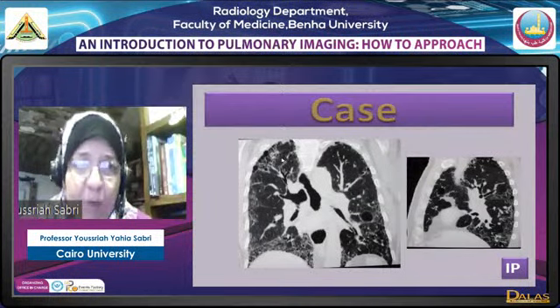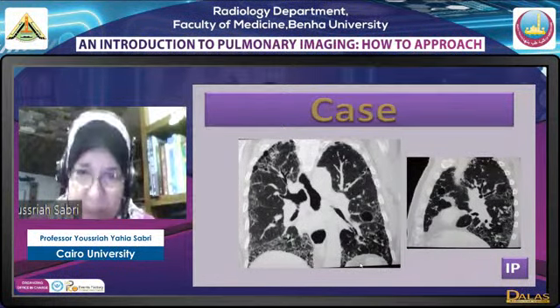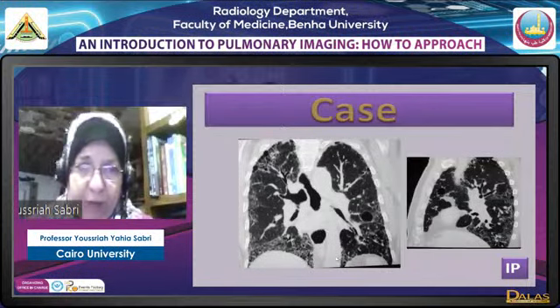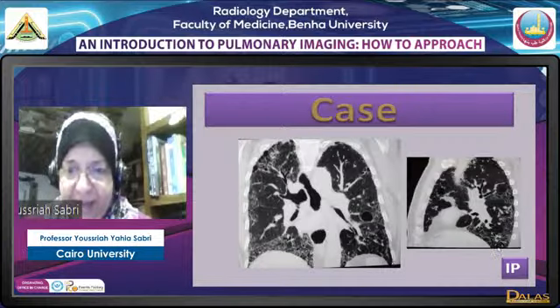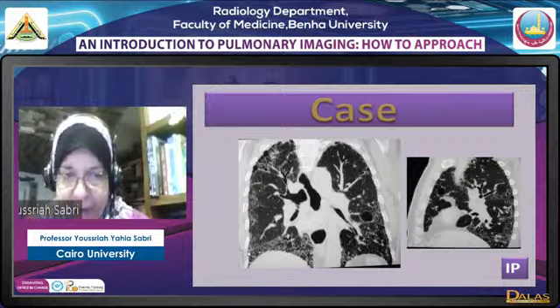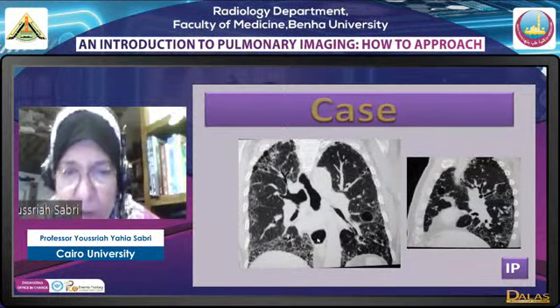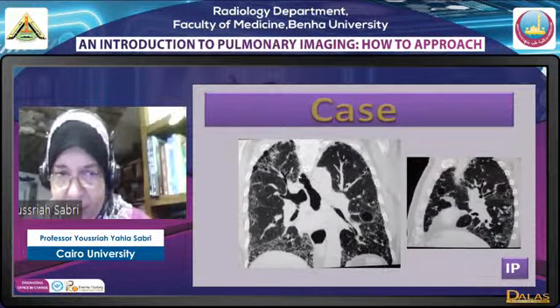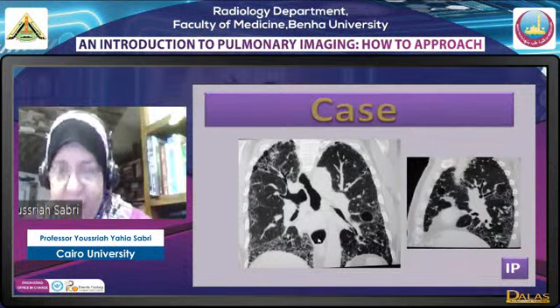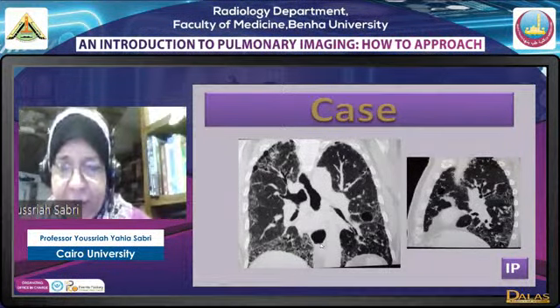In this case, we have again the bilateral, fairly symmetrical lesion with predilection basally and subpleural. We have subpleural predilection, predominant basal affection. Pleural recesses are classically affected, okay? Those linear structures inside are traction bronchiectasis. And in addition, we have this structure. What is this? This is a dilated esophagus, okay? So this is an interstitial fibrosis with dilated esophagus. This is a case of scleroderma.